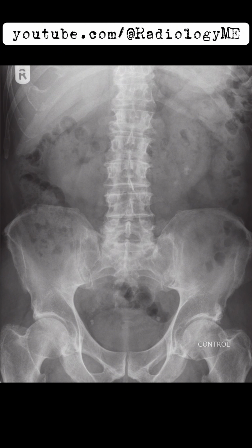Now, this is quite characteristic of a horseshoe kidney, a common renal fusion anomaly. But let's not jump to conclusions just yet. The presence of fusion suggests we're on the right track, but we also need to account for other findings.